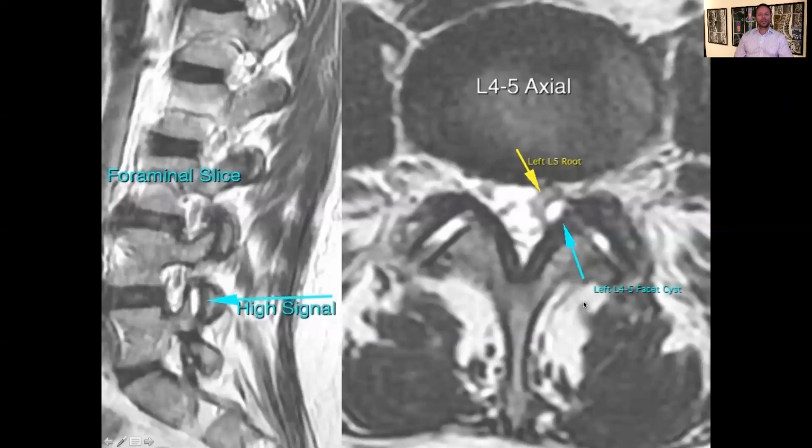I just wanted to share another case history of a patient I saw not long ago, about 6 months ago. And it just kind of proves, as I've gone on the case history page, how important it is to understand your own patient's images. So I'm just going to share the screen here, and we have a patient who has been suffering with, like I say, left leg sciatica.